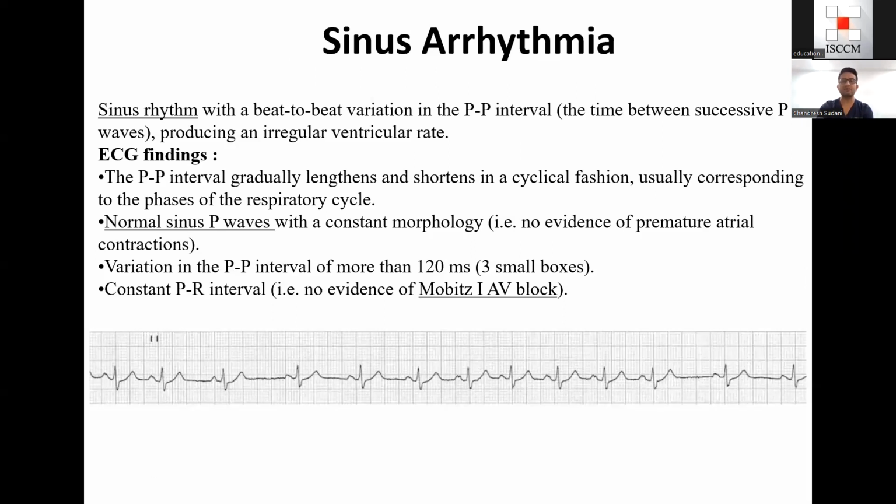Now coming to sinus arrhythmia, many times we see this kind of ECG where you will find QRS complexes and P waves, but the distance between two QRS complexes will be different. Many times people debate that because of the irregularity between two QRS complexes it can be some other rhythm. But you can see in each cycle all the segments, Q, R, S, P, and T, are there. Still this is an arrhythmia, and that's why it is called sinus arrhythmia.